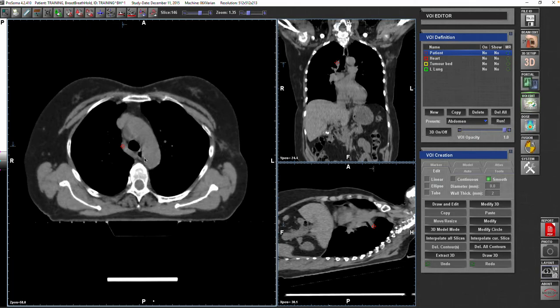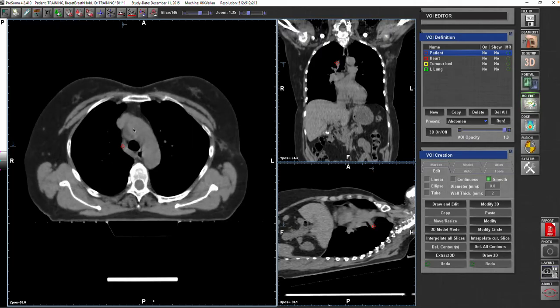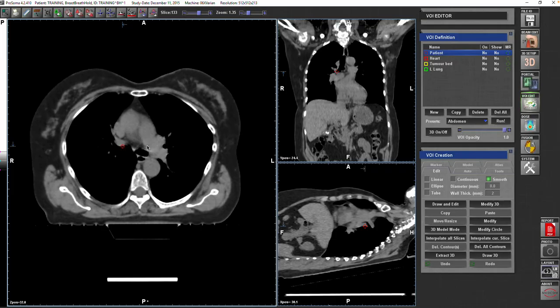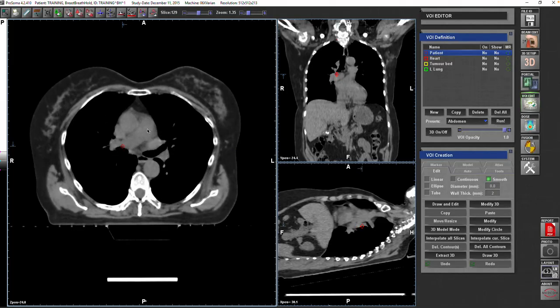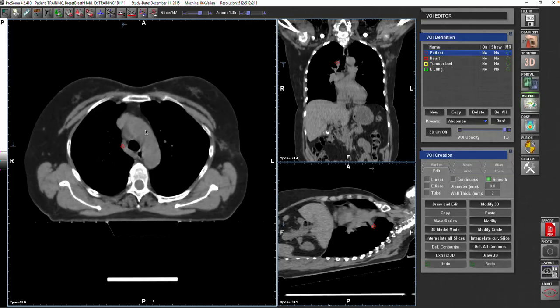Let's start with the mediastinal window, CT axial view. We all know what we call the arch of the aorta, the banana-shaped structure inside the chest. You cannot mistake it because you can see that below it there will be the heart, and then you follow the aorta till you get the pulmonary artery. The arch of the aorta will come in the upper part.